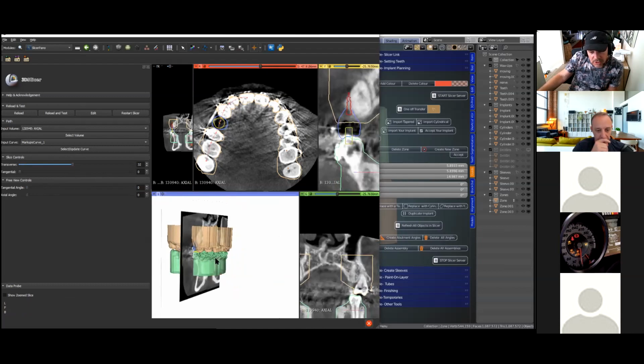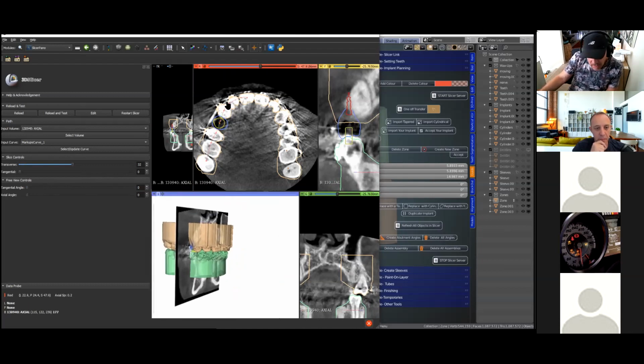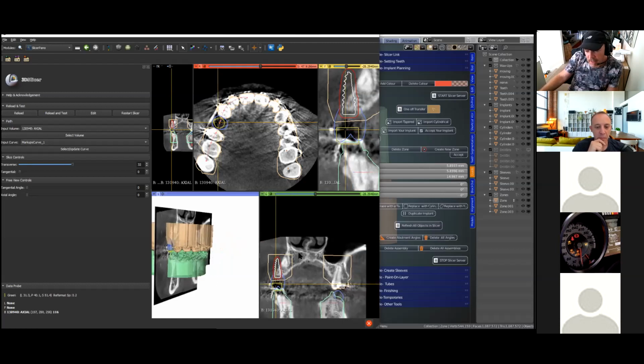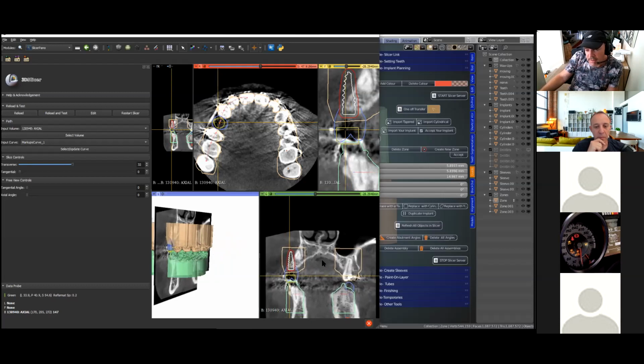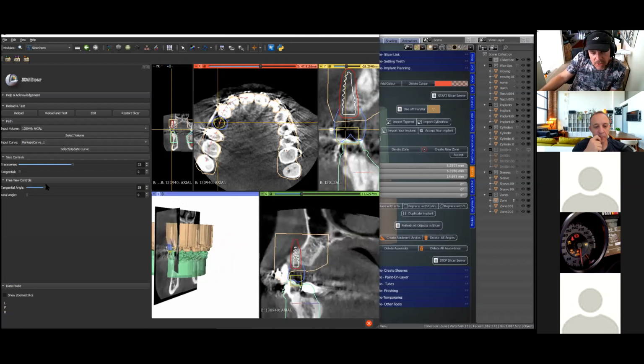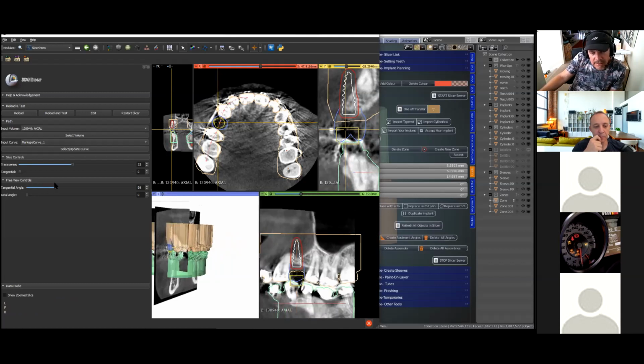I'm actually watching that on this specific, and holding down the shift key, I'll be able to see there. And I'll just open this a bit, and wow. So you can see the initial placement is completely wrong because the bone is angled like this. Not only is it angled this way, it's also angled the other way around as well. So the tangential angle is usually always around about 90 degrees.